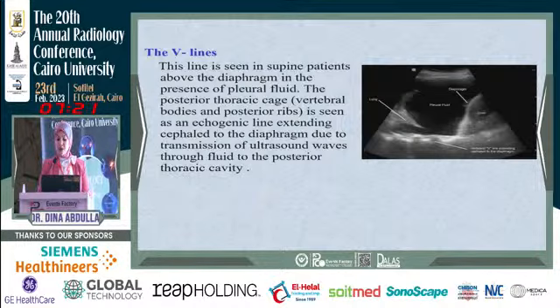We will discuss a few of the commonest findings in chest trauma by ultrasound. Chest wall injuries such as rib and sternal fractures are widely seen by chest ultrasound. Here we can see a rib fracture, interruption of the cortex of the rib. We can discuss the presence of displacement, overriding, angulation of the rib. We can see also in this image there is a comminuted fracture with multiple bone fragments.